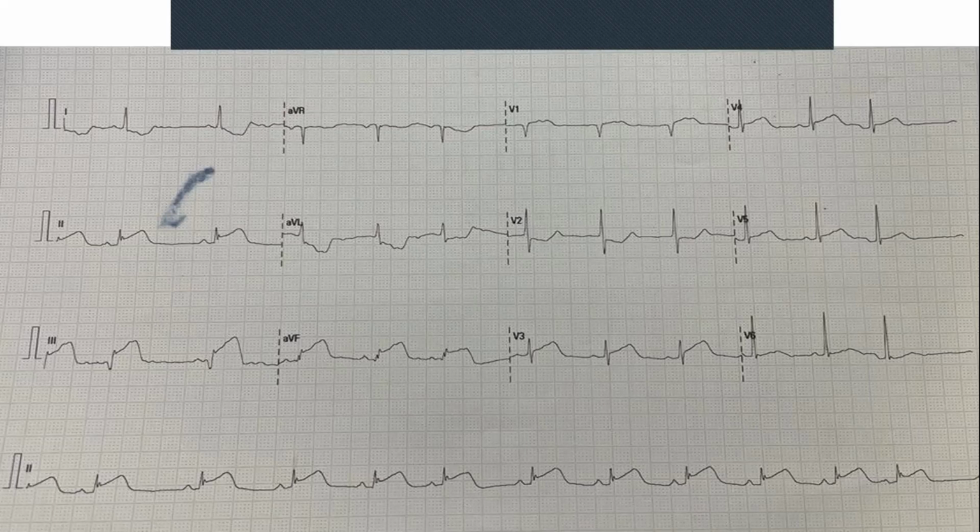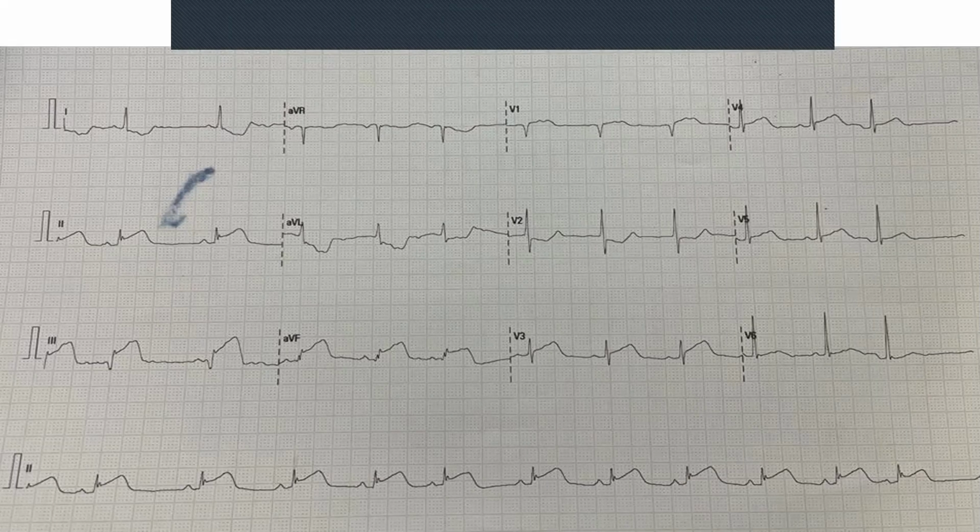Keep on going. Right? So aVR sits on the right shoulder. aVR is often called the forgotten lead because it doesn't serve too many purposes. It's just looking at one side. So it may show you changes, it may not. In this case, it's not really showing any changes. It's within its normal levels. Now let's look at V1 and V2.